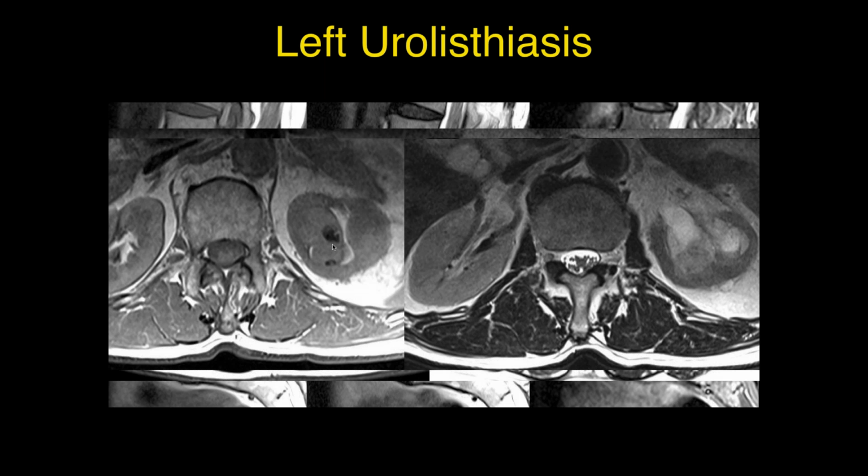Well, they can always put a cage in there and yank it out, but that still may not be the cause, would it? Well, this was acute pain. The patient had had the degenerative spine disease for a long time. This was on top of his usual and customary back pain. Again, I just point this out to remember all acute back pain may not be in the discs and the spine. Got it. Just want to emphasize you have to look at the retroperitoneum.